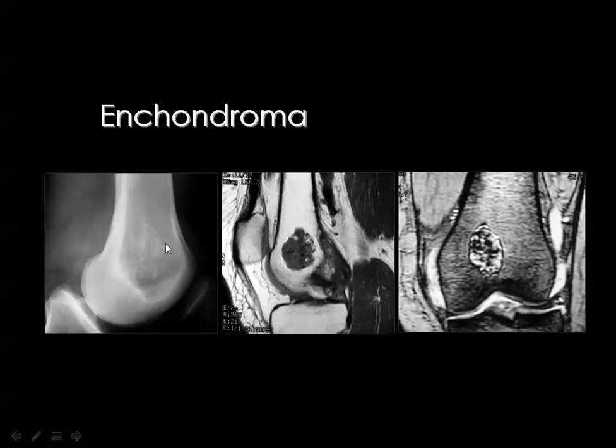You see in the plain X-ray some bone sclerosis. In the MRI, you see a low signal lesion with internal dark foci of calcium. In the T2 weighted image, the lesion will be bright with the sclerotic margin and the internal foci of calcification. Then the radiologist will leave the whole evaluation of the knee and will concentrate on this particular lesion, which is an incidental finding, and starts to describe it in full detail, considering the signal, the length and the width.